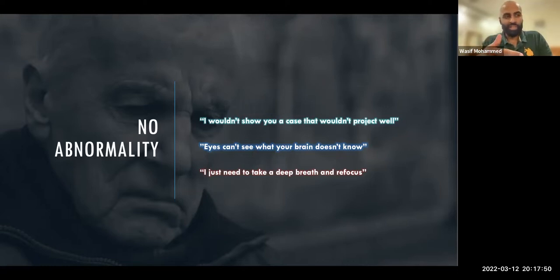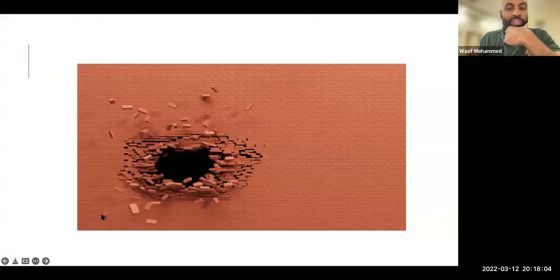Like last time we had the case of cleidocranial dysplasia where bilateral clavicles were absent, and sometimes you have the sacrum which is absent. So it will be very obvious. You just need to go through your review areas to reach the abnormality. So eventually you can smash the brick wall. So let me just go through the questions.